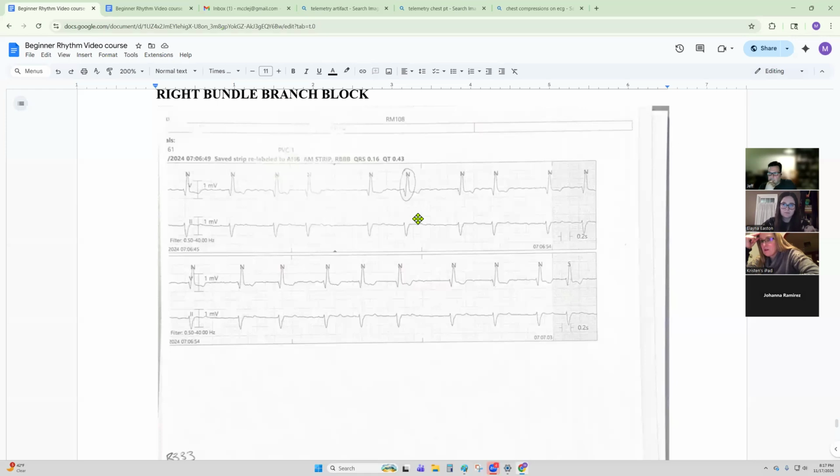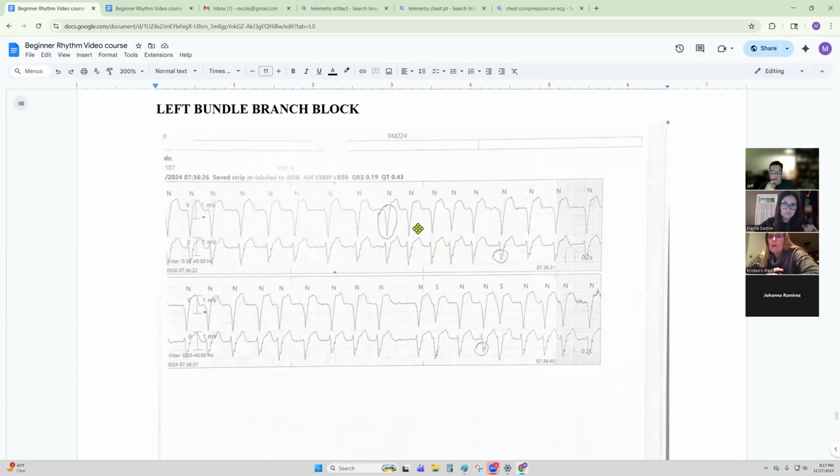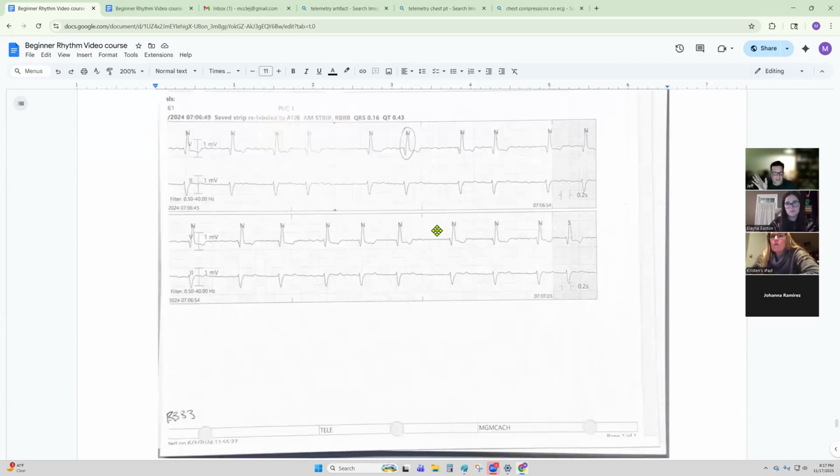Or in AFib, you can't really do that because of... Well, no, you can measure the nadir on that. I mean, we haven't talked about that yet, but you can see the rapid downward stroke, and it's very quick. Yeah. And the nadir is the beginning of the QRS complex, the bottom of the QRS, the R wave. Okay. But let's keep it separate right now.